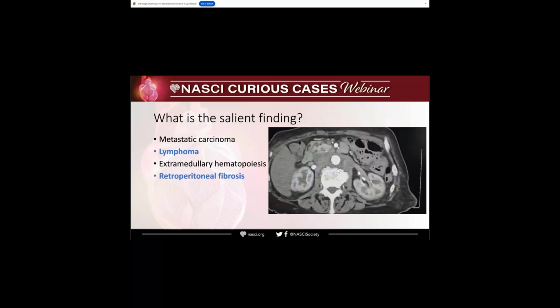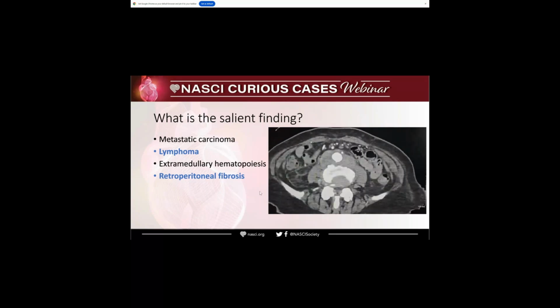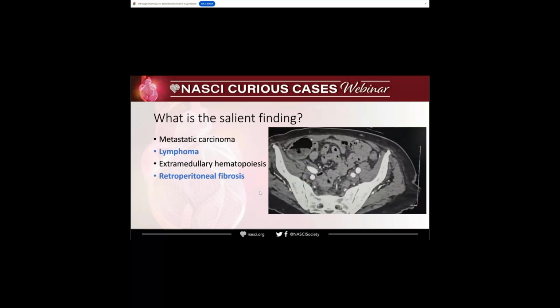So you see the space behind the aorta is not supposed to be there. It's a potential space. So this is a conglomerate of something that displaces the aorta. It doesn't hyper enhance, and it starts a little bit proximal. So lymphoma is definitely in the differential, and I think a biopsy, or a combination of everything, is definitely in order. But it's a very good discussion, very good.